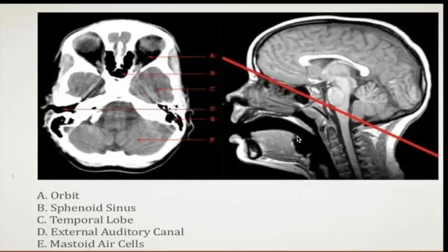And F, can someone identify from this image here, look at the line. From this image here, can someone tell me, are we looking at the occipital lobe, or are we looking at the cerebellum, looking at the red line? What are we looking at?